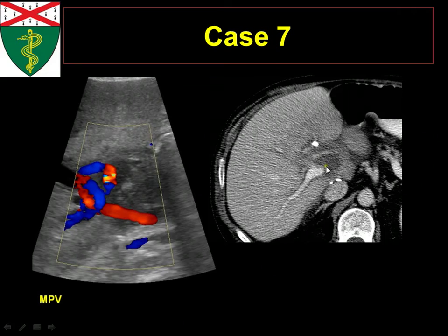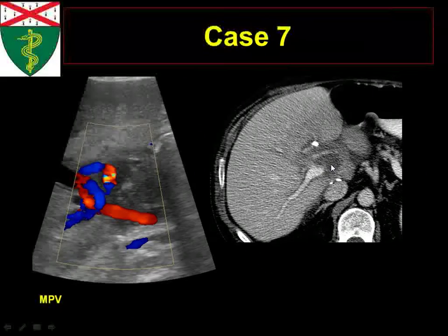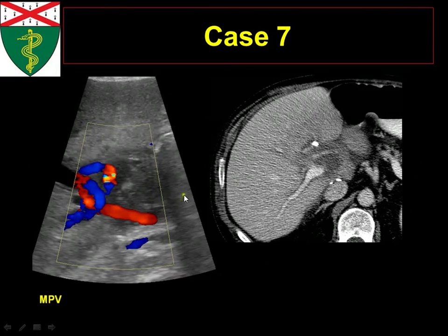So what do you see over here? Yeah, so there's a hypodense area in the liver. Okay. The caudate lobe. Yeah, I'm not sure if it's in the liver or perhaps this is the caudate lobe and it's in the porta hepatis. It looks pretty infiltrative, right? I mean, you can't really define the borders. And again, it could be a collection of a lot of material that's very tenacious and difficult to move around. But alternatively, it could be a very infiltrative solid mass, and it's been there for a while. It's not going away. So what are we worried about in this case?